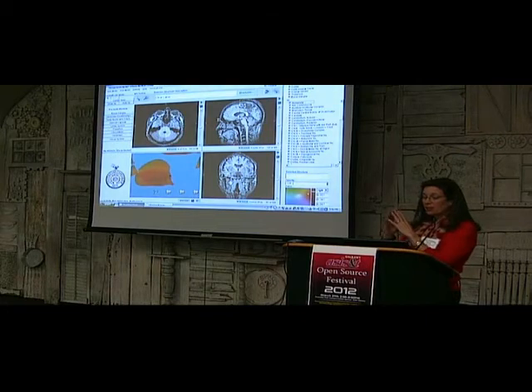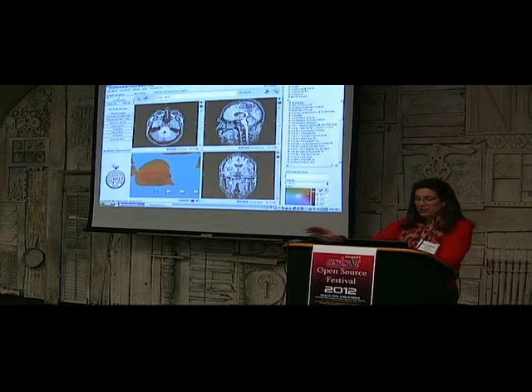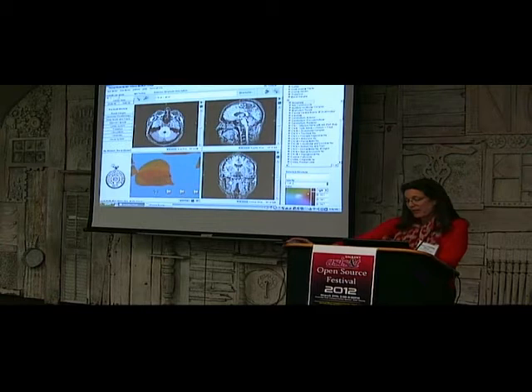All right, so what we're looking at while it's thinking is the standard user interface page for the software. And you can see there are the 3 standard imaging planes for MRIs. And we like the fact that our students can correlate what they see in the 3D window with what they see in these images.